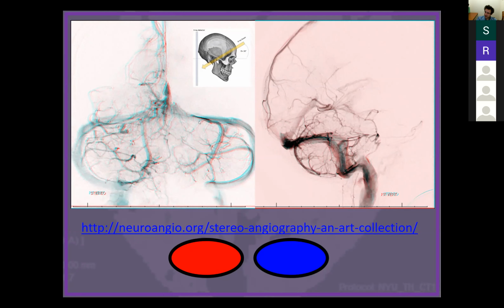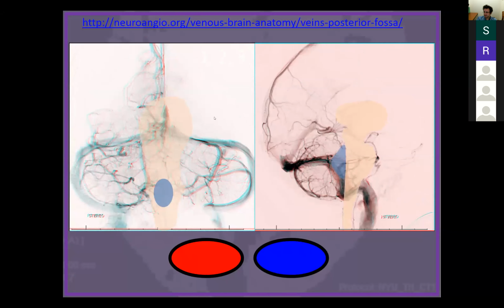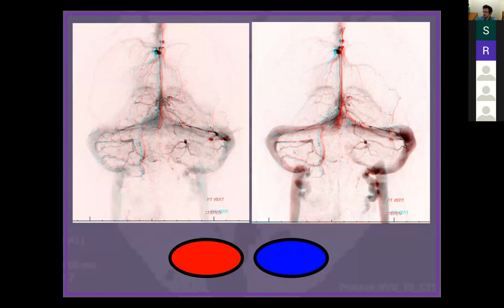They will drain into a segment of a venous sinus in the tentorium cerebelli, way more than 50% of the time. And that's called the tentorial sinus. We're going to come back to that because you're going to see this again and again, and it actually has some important implications. It's like a little quirk maybe, but it's important. So again, here we go. This, right? Here's another one, another individual.